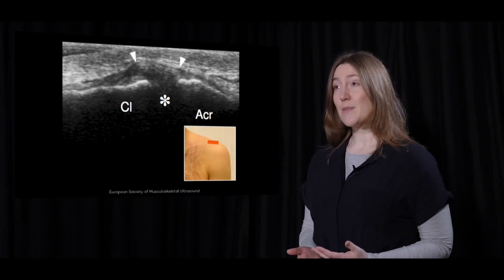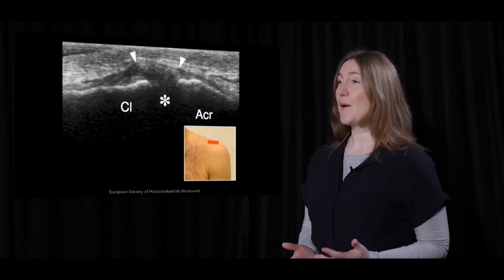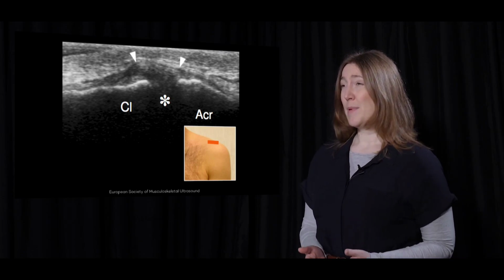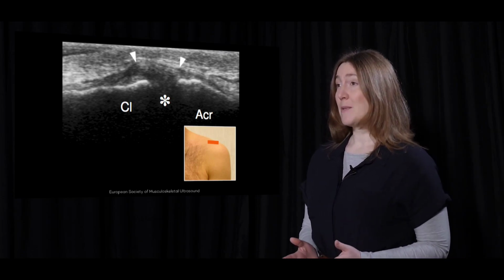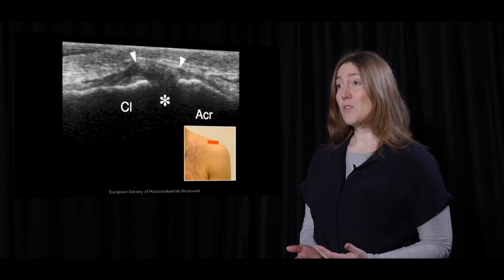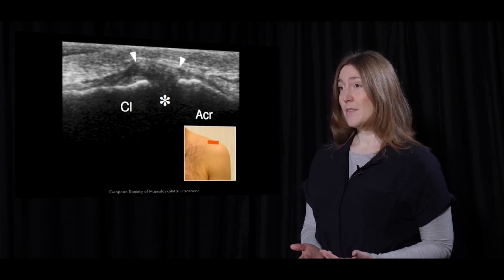The problem with ultrasound is that the hardness of the bone doesn't allow any penetration of the ultrasound beam. As soon as the beam hits the bone, it will be reflected back to the transducer. That reflection limits ultrasound assessment of the bones.